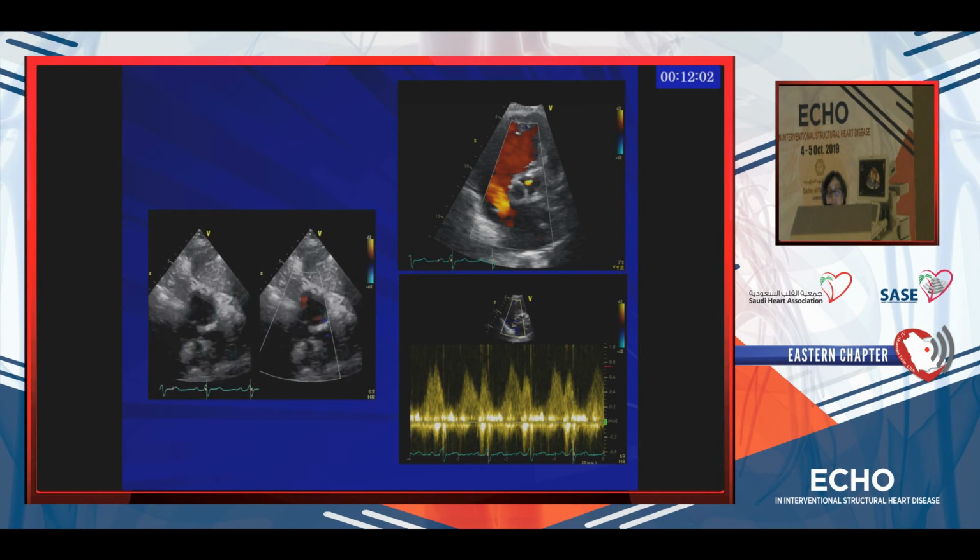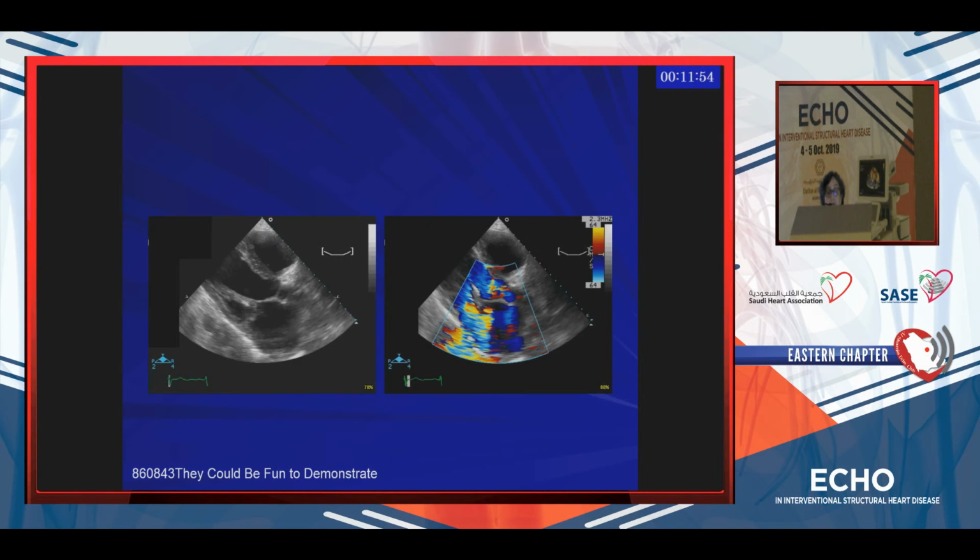And it's the same patient, you even manage to do the color and to do the Doppler, and usually you have systolic and diastolic flow across the interatrial septum. And sometimes it could be fun to demonstrate.